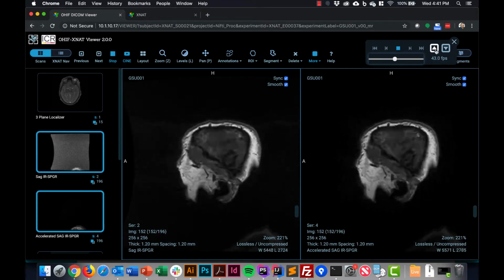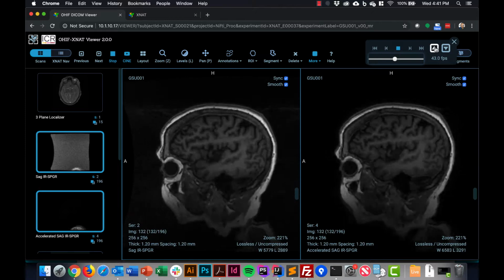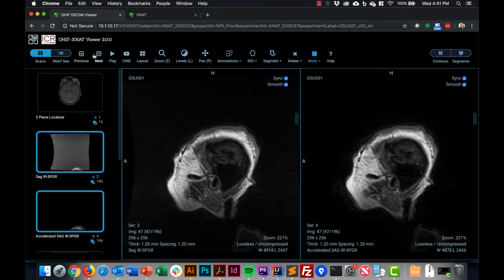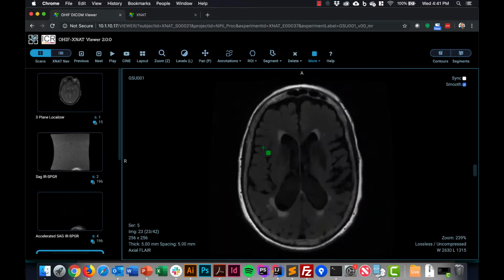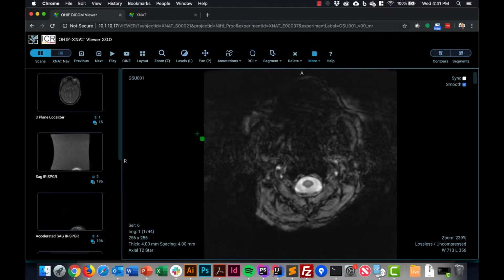And you can see here we've got little arrows up and down on this command, as well as over here in this part of the menu. This just advances the scan. So if you want to load the next scan, I'm not sure how useful that is. You can just click and drag the thumbnails just as easily.